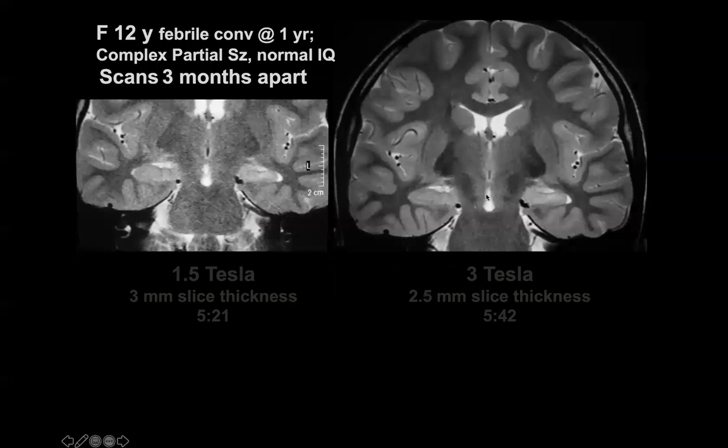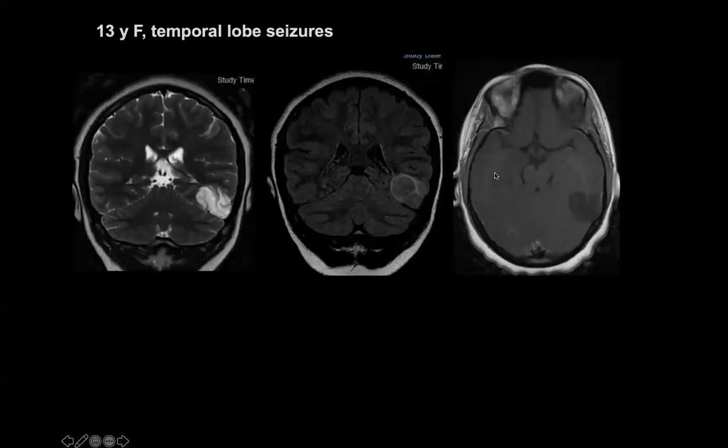This is another case. You see the hippocampus here is brighter and the gyration, which is normal on the right, is lost on the left. These are typical findings of meso-temporal sclerosis and also show you the difference between, I have to say, a terrible 1.5 Tesla. I saw the 1.5 Tesla scanner and also 0.3 in Nigeria. They are very good. But you can see the difference between a 1.5 and a 3 Tesla.